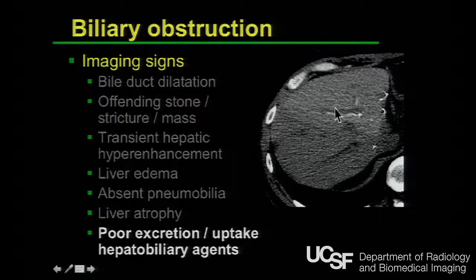For CT imaging, we can see in this case, the patient has had a hepatectomy, reanastomosis of the bile ducts. In the anterior liver, after receiving the hepatobiliary specific agent, cholographin, there's excretion of contrast into the non-dilated ducts of the liver. And in the right posterior duct, we don't see uptake of contrast into the parenchyma. We don't see uptake of contrast into the biliary tract. It was a right posterior segmental branch obstruction that then the surgeon could go in and do spatulation of the bile ducts and reanastomose with relief and return of liver function.